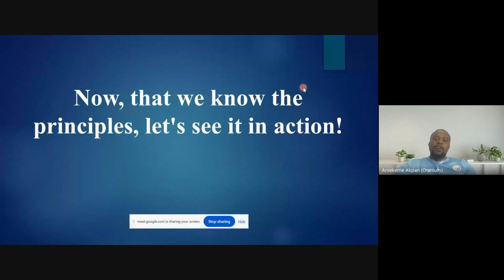So now that we know the principle, let us see it in action. Everything that we have learned, everything that we have talked about, let's see if we'll be able to identify. Some persons will also try, and I myself will also try. We'll try and see.